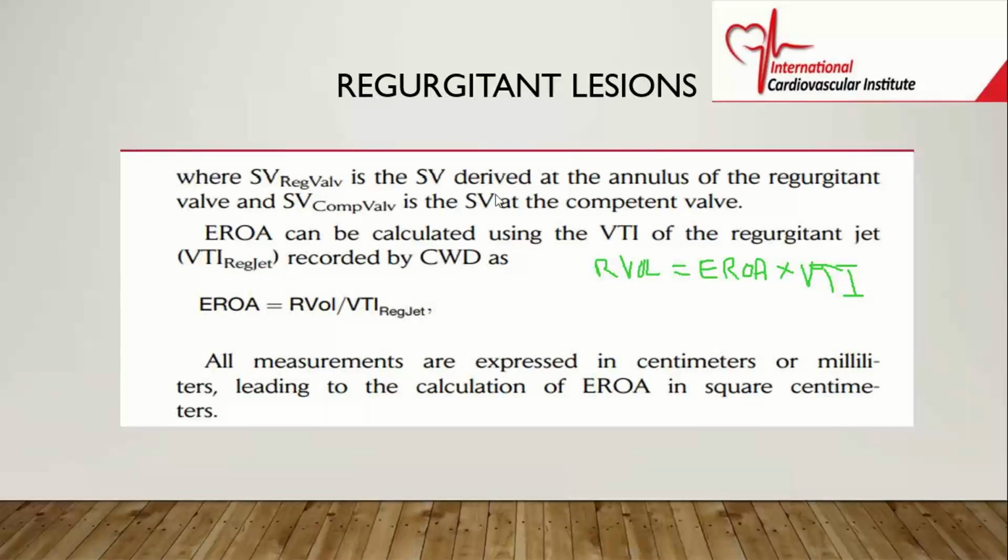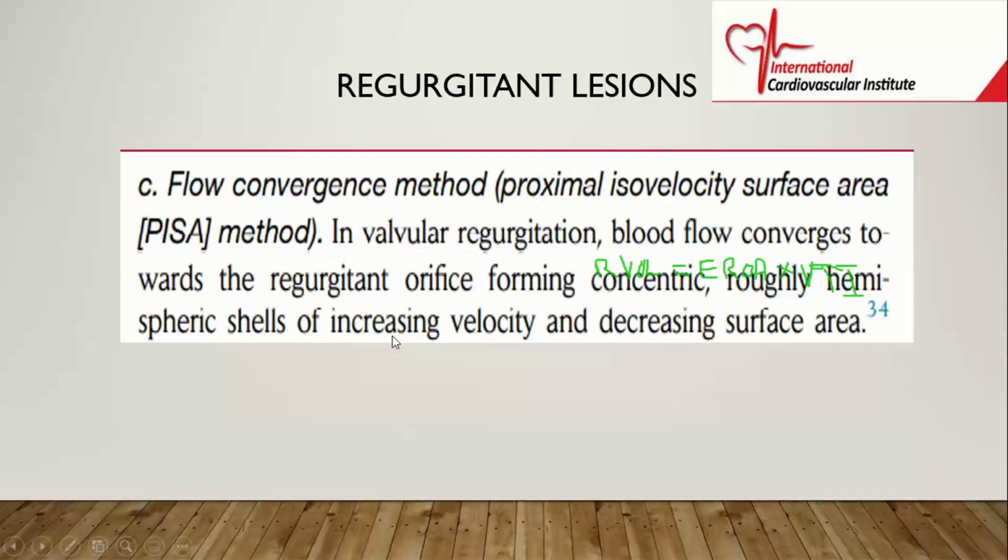So this is using Doppler, but we can also look at the flow convergence, and the flow convergence gives us additional means to measure the severity of the regurgitation.